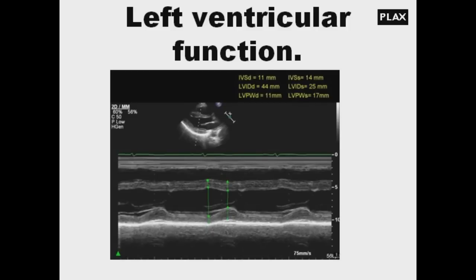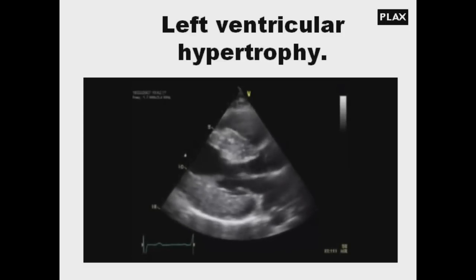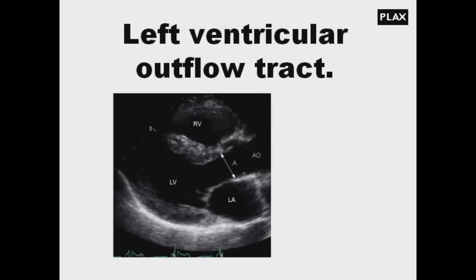The picture shows the measurement of ejection fraction with M mode. The orientation of this view is excellent to measure the left ventricular outflow tract.